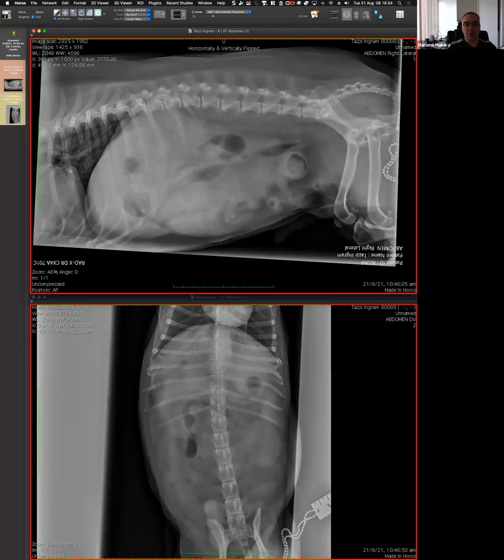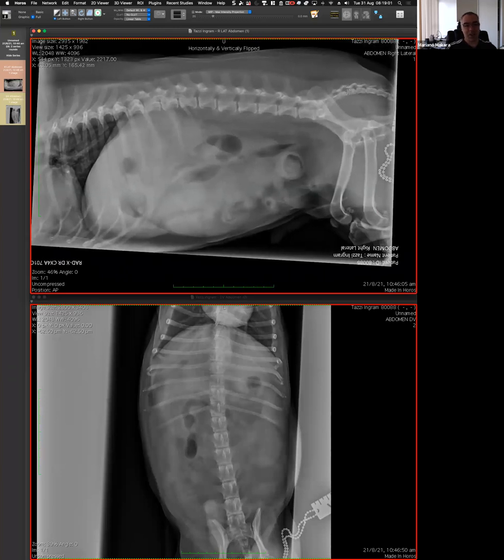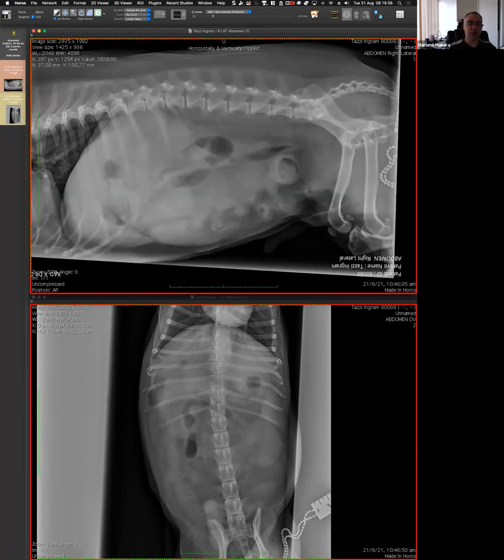That is a weird looking tail, but it's not an unusual looking tail, and I'm not that concerned. And probably something else that I would, even if I don't have that based on experience, I would say, well, if that is real, then I would expect the dog having some issues more than vomiting, defecating, and then I will probably immediately go and see if that is real and there is such a big mass.